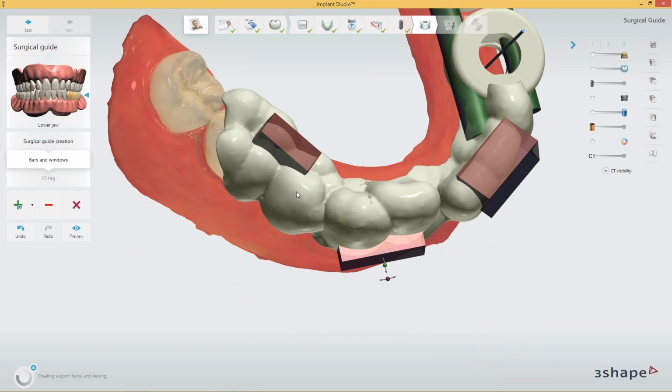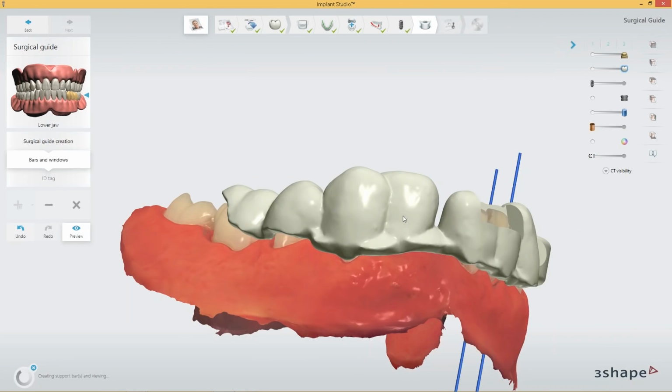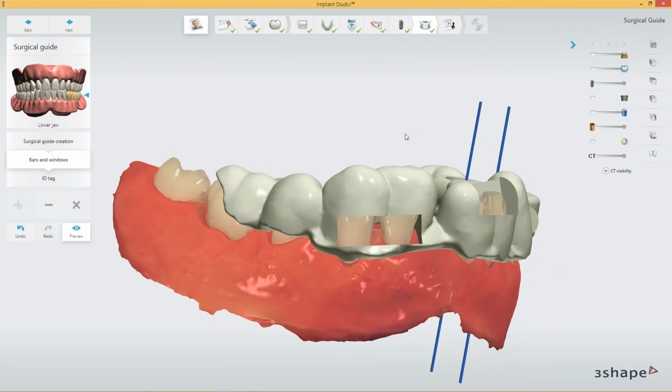So it doesn't matter where we place the window, it will just cut a hole just as you imagine that it would. And don't be afraid if you only cut a hole from the side you're looking at the guide, so it will not do a cut through all the way long. You have this option to extend the cutting area or range by extending the box using the handles, making it smaller, rotating it, or just moving around. Very nice, looks very good.